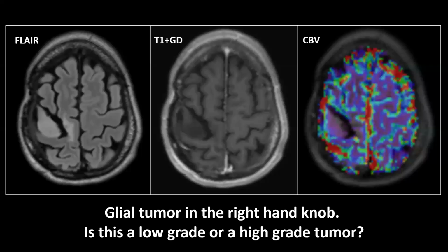Let's compare that with this tumor. We see a tumor in the right hand knob. This is a recurring tumor. The patient has already been operated in this region, as you can see. Now the question is high grade or low grade. If you look at the T1-weighted images with gadolinium, we see no enhancement whatsoever. If we look at the cerebral blood volume map, we see no increased perfusion. So, based on these findings, we are inclined to say, oh, might be low grade.